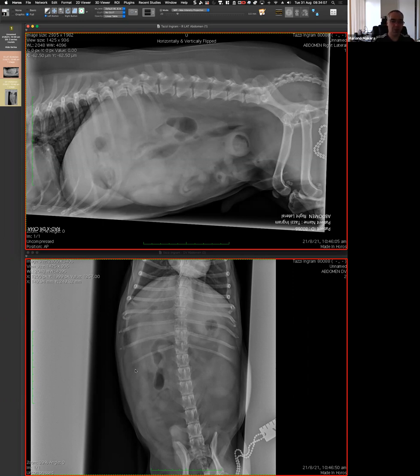So it's still a mechanical obstruction. Makes sense? So there is a mechanical obstruction of the passage of content through the GI tract, but the whole small bowel is going to look completely normal. So be aware how we use the rule, and be aware about the exceptions to the rule. So that's a perfect comment.